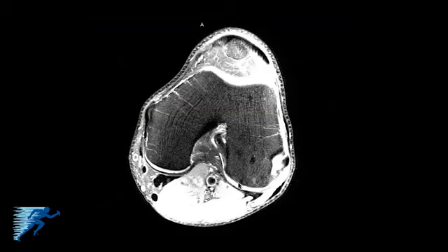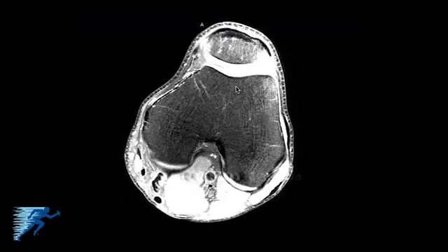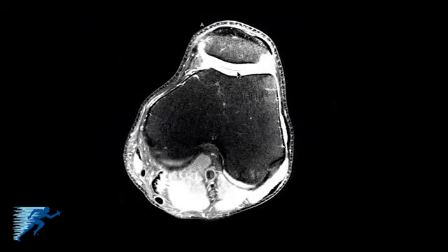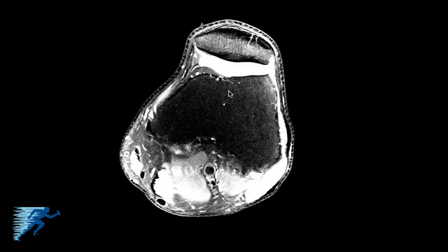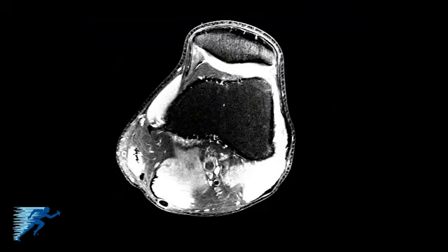As we start to get further along, you'll start to see the articular cartilage in the posterior aspect of the femoral condyles, and now we'll start to see more of the trochlear groove up in here, and also the articular cartilage of the patella. So the articular cartilage of the patella is going to be along here. And then we'll start to get into the suprapatellar pouch, which will be above the trochlear groove, and we'll see more of the articular cartilage on the patella.